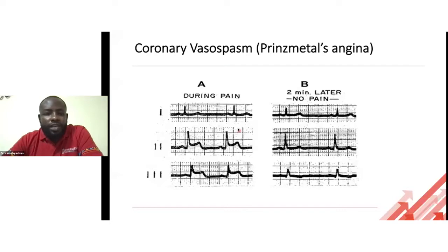and say patient has Prinzmetal's angina, pain medications, aspirin, go home. Okay, remember patients don't read books. Could be Wellens, it could be STEMI, okay? So as long as you're seeing ST elevations and you're seeing reciprocal changes, even if within 2 minutes the ECG normalizes, escalate these patients. Let the cardiology team see these patients, let them determine whether this is a vasospasm or it's a STEMI, okay?